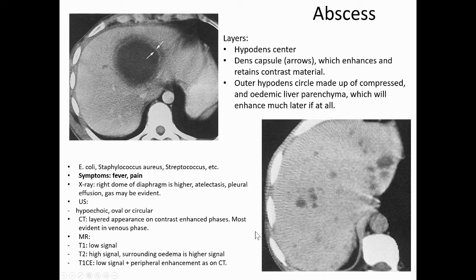Abscesses are fortunately not that common in the liver. An ultrasound is suggestive, but it's not diagnostic, and neither is an X-ray. But again, for those of you who might become radiologists, I wrote this on my slide. CT is very suggestive and typical. So the center of the lesion will be liquefied.